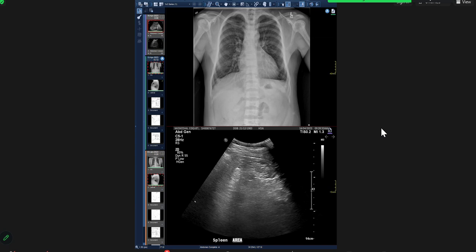So this was just a spot film in which I wanted you to spot the sickle cell anemia, and you did, and it is a very basic film. So these are one of the easier films, but they are quite few. They show you these ones quite few. Mostly they are usually with complications. As soon as you spot that you don't see much abnormality in the lungs.